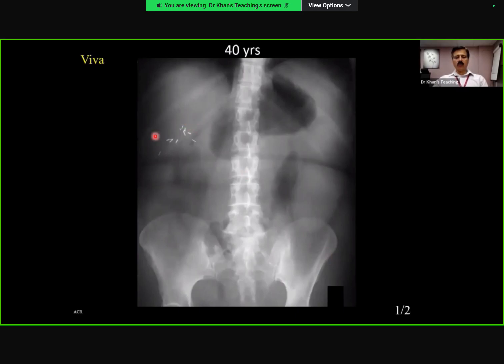So this patient is post-cholecystectomy, and I am not worried about this. Is there any abdominal visceral abnormality? Over to you, please. The spleen looks enlarged. Excellent. So this is the teaching point here, and this has come in the exam quite often. Please remember that, protocol-wise, you have to look for any visceromegaly or things like that. And here, this is the spleen. And this spleen is enlarged.